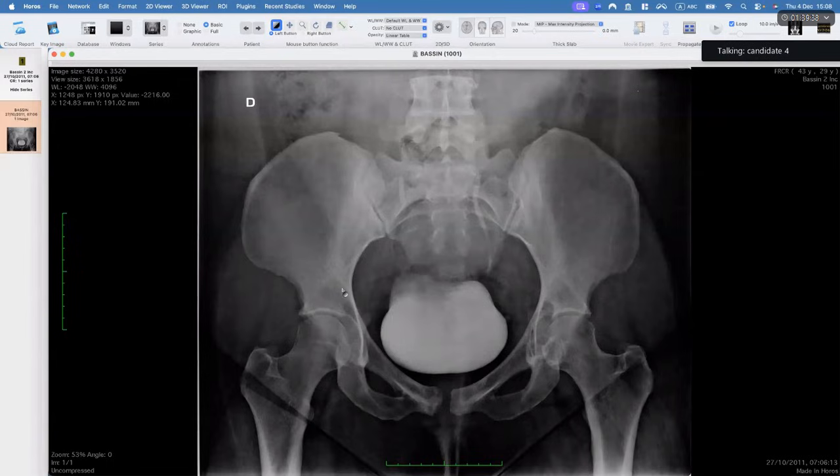Hip pain. I've been presented with a frontal radiograph of a pelvis of a skeletally mature patient. In the first instance, I can see there are multiple lytic areas involving the pubic rami bilaterally. Also, I can see some lytic areas involving the left femoral shaft, neck, and head. Bilateral hip joints are otherwise unremarkable. I cannot appreciate any gross abnormality in the iliac crests or the iliac wings. I cannot appreciate any fracture line. The visible vertebrae, transverse processes, and the visualized part of the sacrum appear unremarkable.